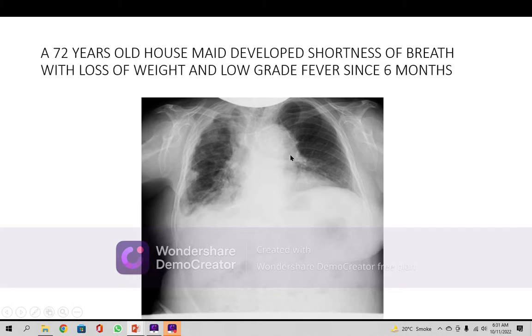Probably the patient had developed secondaries in the ribs, and we also find there is tenting of the dome of the diaphragm, and above it you find there is pleural thickening because it is blocked, it is hazy, and one projection is coming out, lobulated, it is pleural thickening. Here is again a non-homogeneous opacity with reticulations. This means fibrosis or fibrous septa, crossover bridges here in this part. The whole of the lung is involved in this case of this right lung.